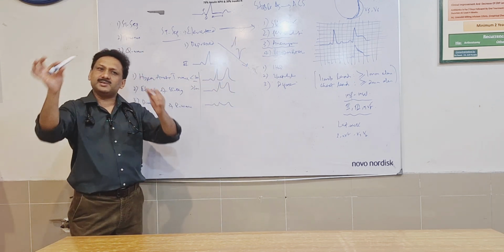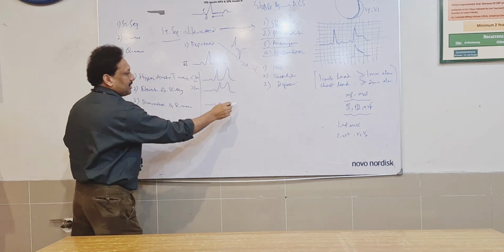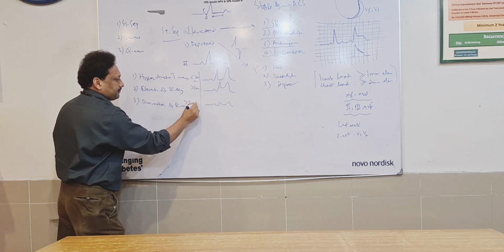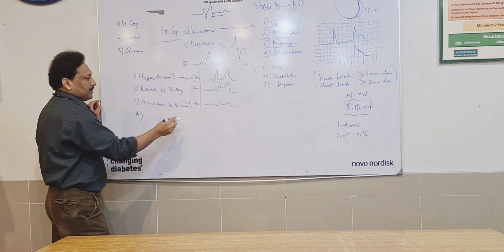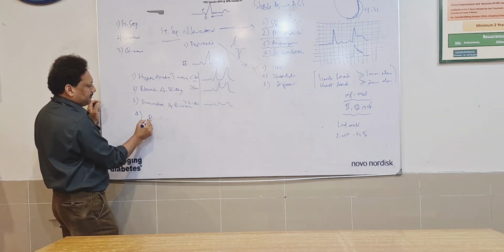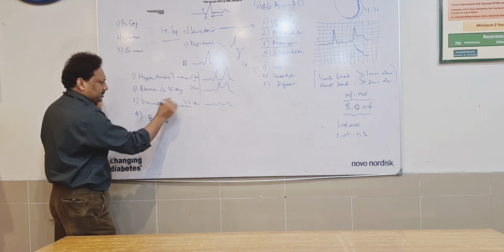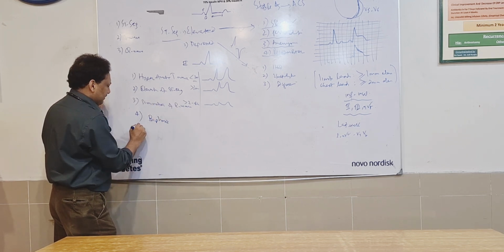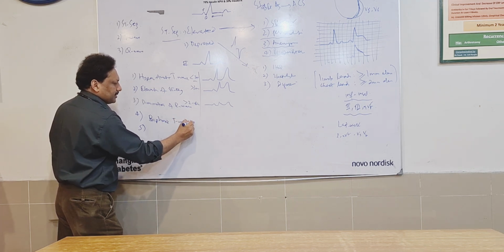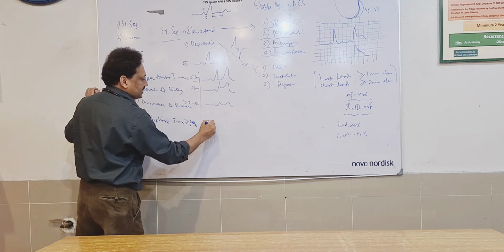The current will be exactly opposite. The wave will be exactly opposite. The third stage is diminution of R wave, usually more than 2 to 4 hours. Then the fourth is biphasic T wave, and these things can go upside down. The biphasic T wave may be present, and then lately this diminution. So these two things almost come together. Biphasic T wave, again 2 to 4 hours, and then this would be the picture.